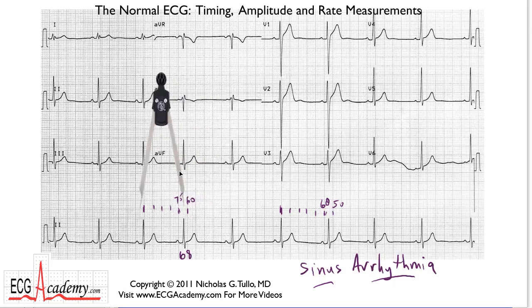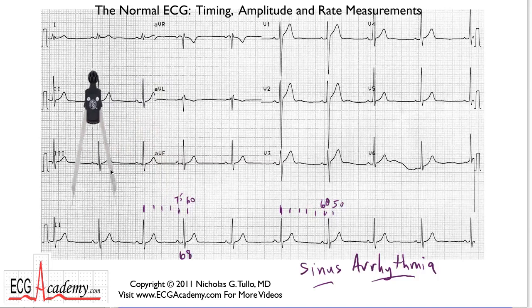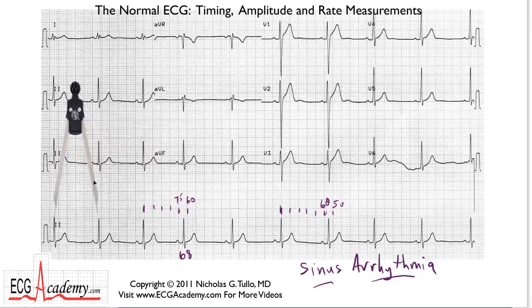Now, the cool thing about calipers is it lets you measure things that don't land exactly on a heavy line, and I'll show you how. Well, let's go back to this first interval here, and we're going to put the point of the caliper on the first beat, and the second one, I could probably resize that a little bit better so that it lands on this second beat, okay? So now that's showing us exactly how long the interval is.